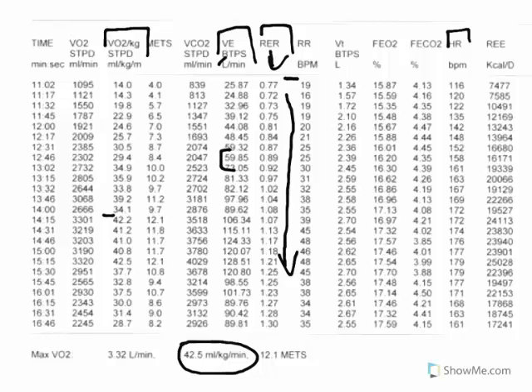So the way you can use this as a training tool is say what heart rate elicited that spike. Well, his heart rate is about 158 beats per minute. So if Curtis trained at about 150 beats per minute, that is the quote unquote sweet spot. The ventilatory threshold correlates very strongly with the lactate threshold.